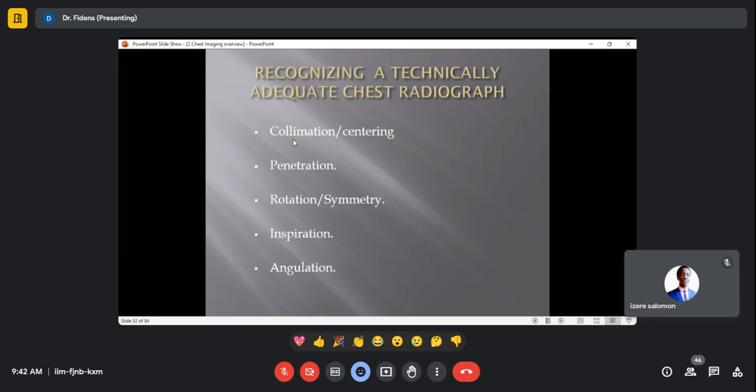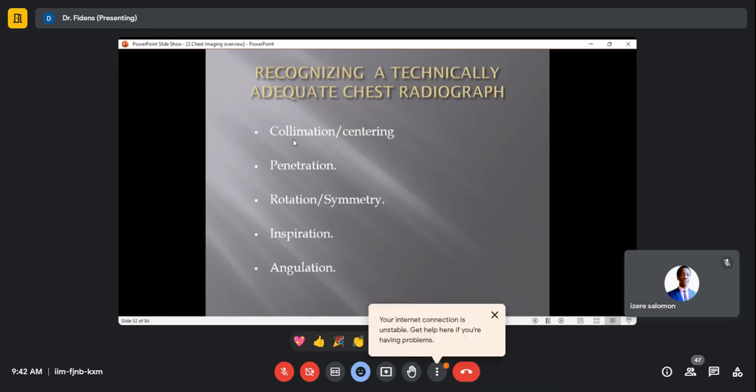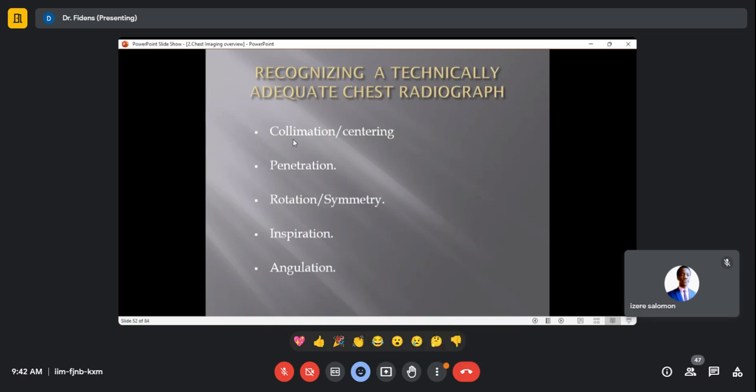Number two, you have to check first if the penetration is good. You remember what I told you yesterday. Who can remind me what I talked about penetration? When the penetration of the film was good, how do you know it?